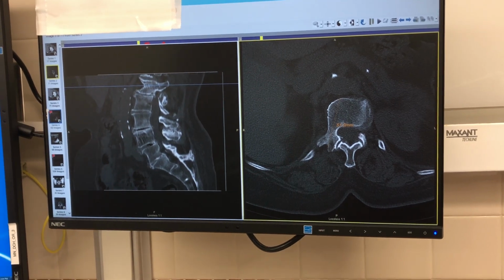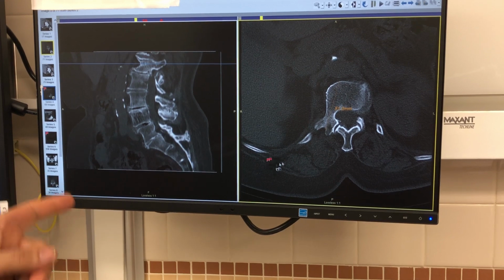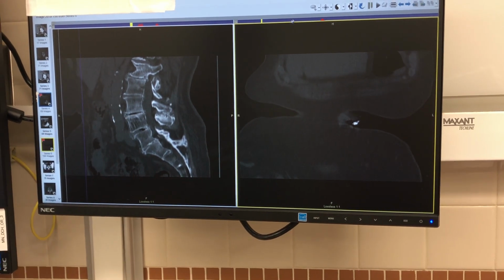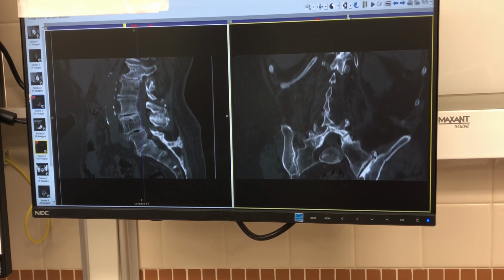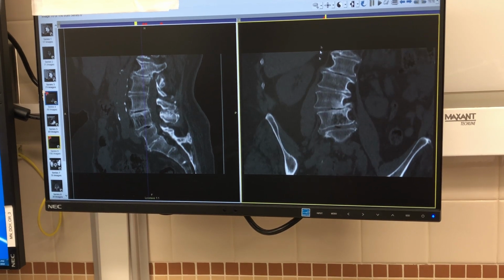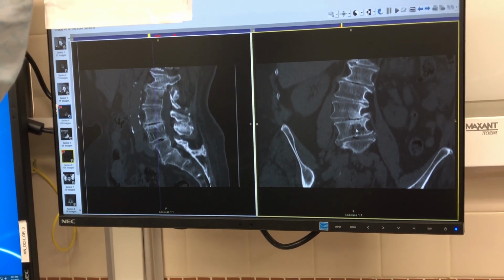Okay, so with the scoliosis, first of all, it's important to have a view of the coronal views. The coronal views are views from the front, and sagittal is from the side. So what we see in the front view is actually the bending. And like here, you see the bending. This is in the front view; in a normal spine, it should go straight up and down.